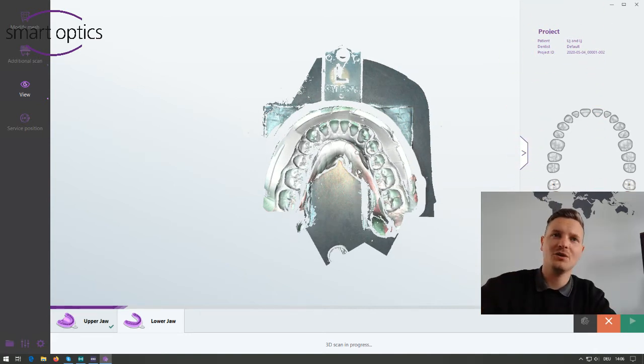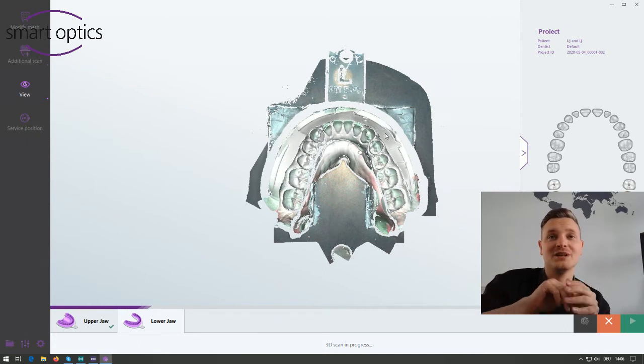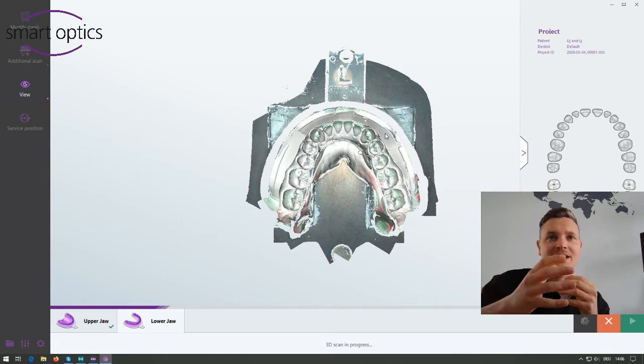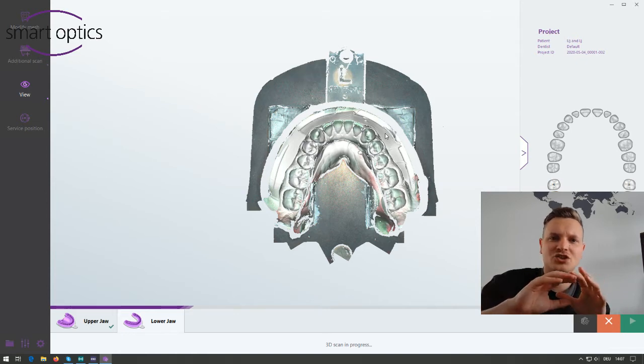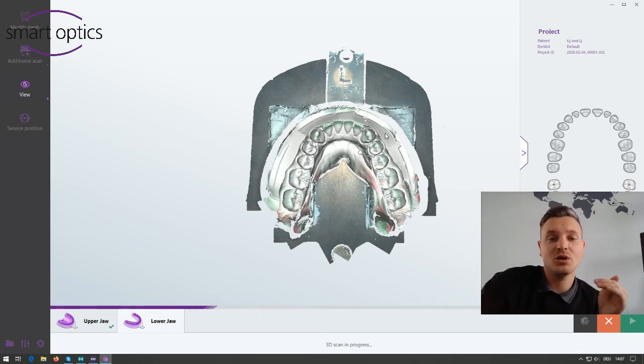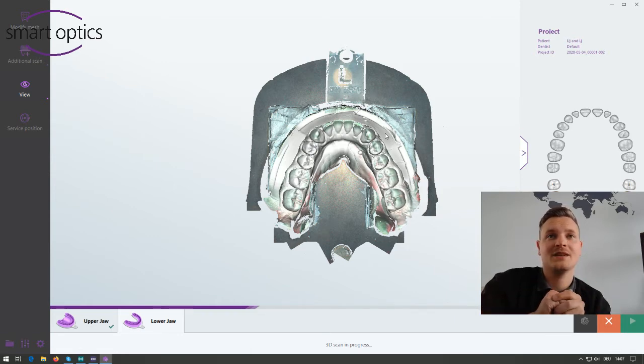viewer, the viewer is the screen that shows you the scanning data. The viewer doesn't show all the scanned parts. So in areas where we didn't get as much scanning data as we wish to have there, these won't be shown. So it could be that you have holes and there's no data shown, but in fact there is data that we can use for calculating the mesh.